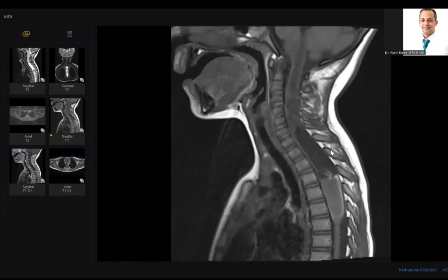This looks like a very large cystic lesion. You tell the examiner, doctor, it may be, number one, teratoma, number two, anything else. But at least give him a hint that you see the fat. Don't worry, doctor. In my sessions, I bring the atypical cases. Don't worry. Yes, tell me, sorry, doctor.